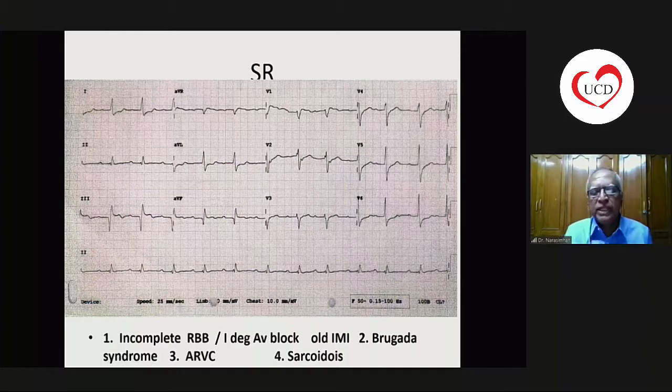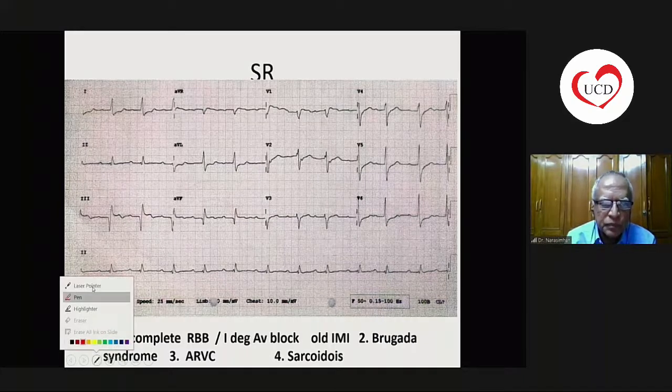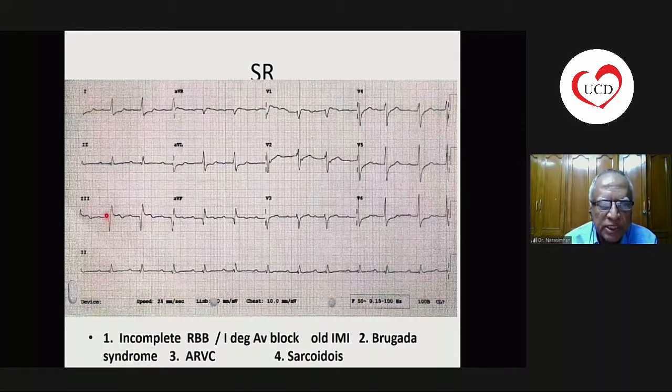Now, my colleague Dr. Deb has written a very nice paper on simple electrocardiographic clues to suspect sarcoid. When you have a person with PVCs and a conduction disease like a first degree AV block, Q waves, and what you see here, let me just show, you see a Q wave predominantly in the infero-posterior leads.